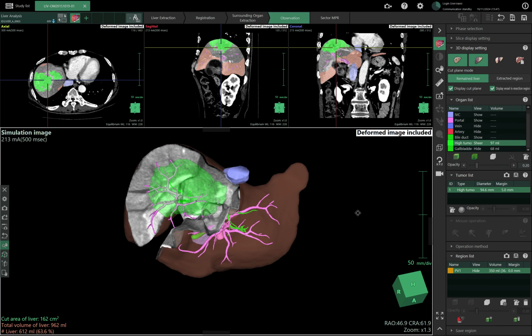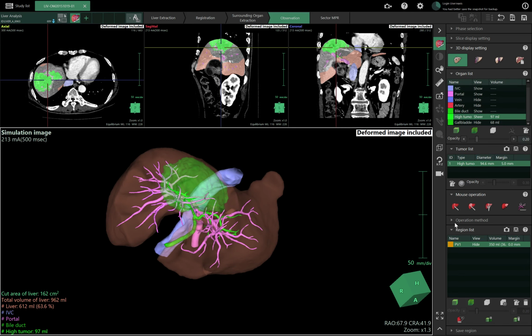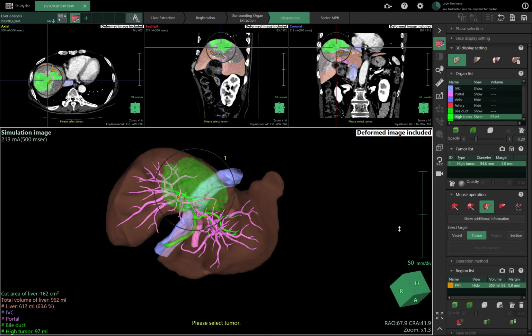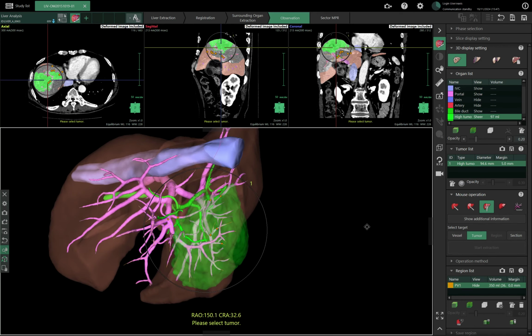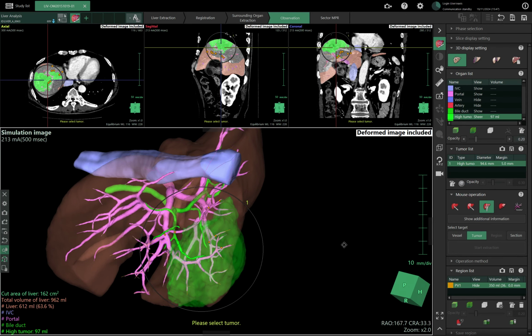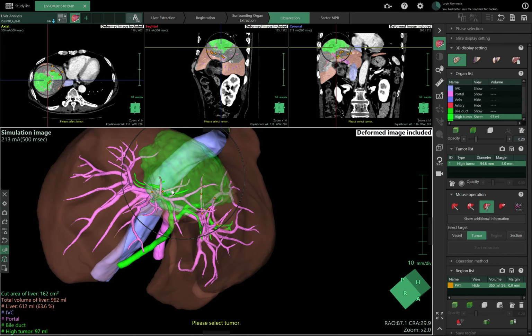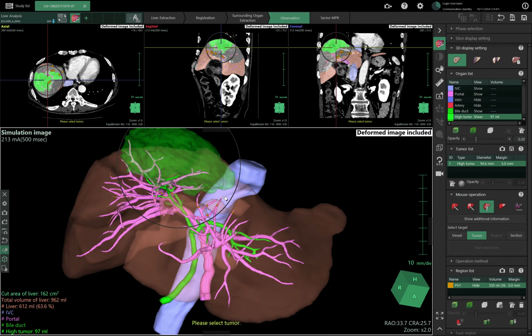Okay, so in this case, if I come back to this tool, if I just undo this and just select this portal, it is going to tell me that these are the branches that will be cut. This is the point that will be cut to have this kind of extraction, as well as some others like this branch of segment 4, which looks like segment 4.